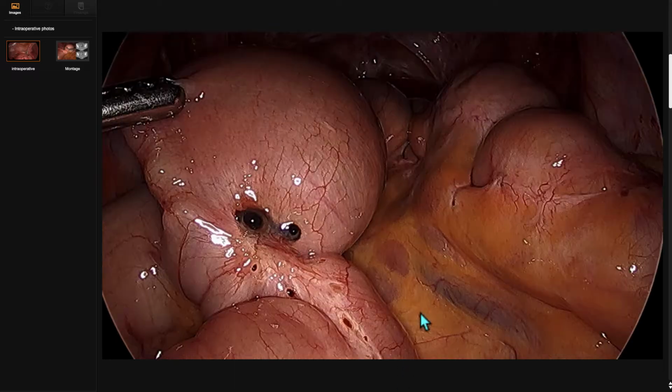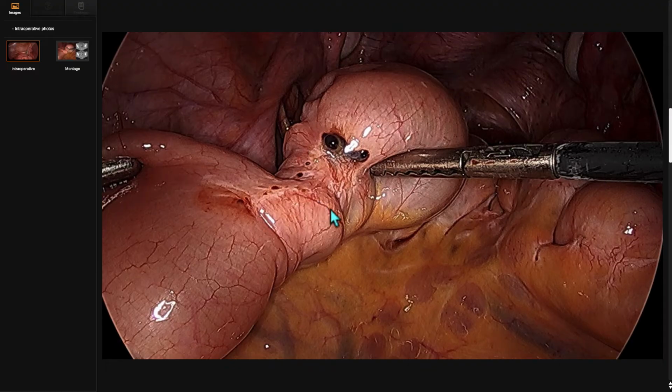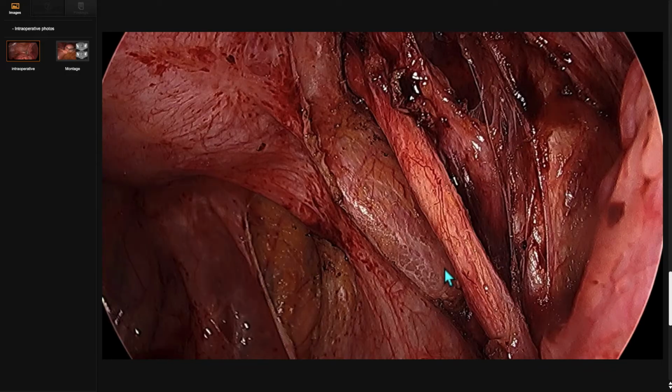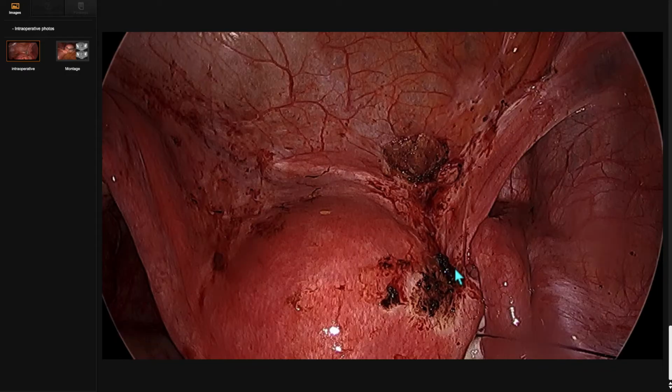In the operating room, they found numerous hemorrhagic deposits within the small bowel loops and peritoneum related to endometriosis, causing the recurrent small bowel obstructions and requiring the small bowel to be resected. It's helpful to consider this diagnosis in female patients, particularly when the cause of obstruction is not clear. You can see the degree of scarring and inflammation related to these deposits is quite extensive and initially relatively underestimated by our first CT.